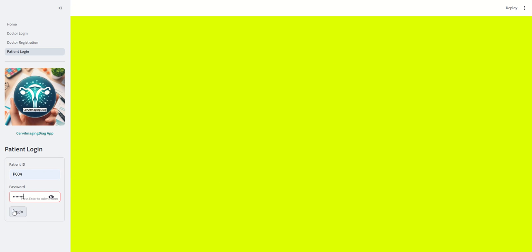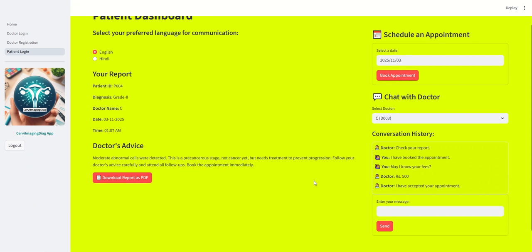After using her login details, the patient came to her dashboard and saw the inputs given by the doctor. As a courtesy, she is typing, thanks for accepting the appointment, and will click on the send button.